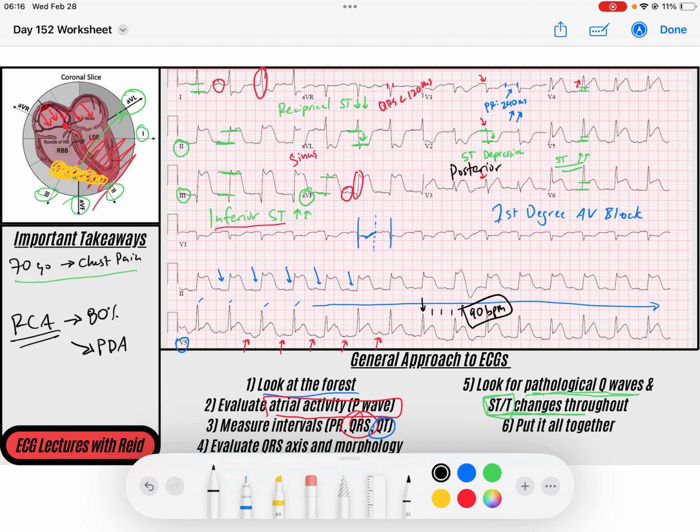And that really hits at, this is probably a right coronary artery disease, right? You've got, to a lesser degree, some lateral involvement, but there is still a little bit of lateral involvement, right? And remember, V5, V6 are more of the low lateral, right? 1 and AVL are high lateral, V5 and V6 are kind of the low lateral, right? They're in the armpit. And so this is all pointing towards this right coronary artery that's a dominant RCA that supplies the posterior descending, and so we get a little bit of that inferolateral.